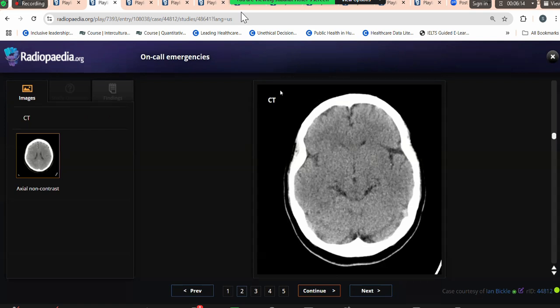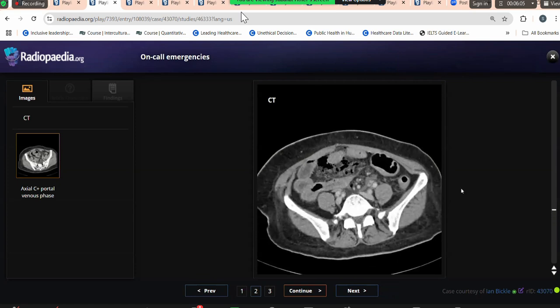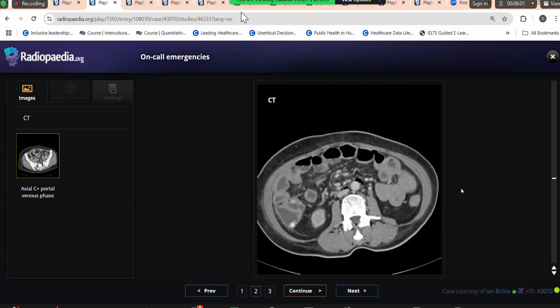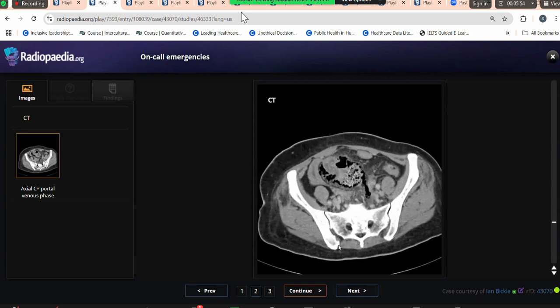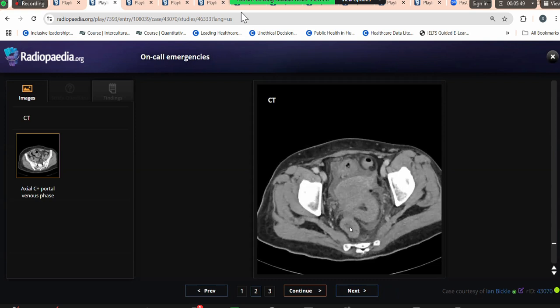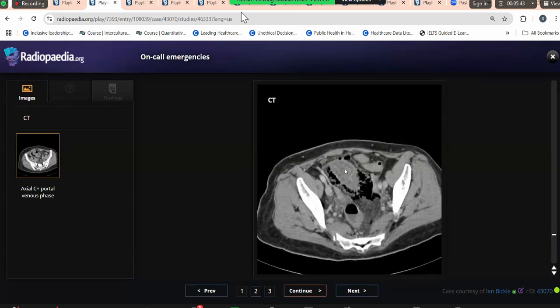After that, candidate 3 came up. Now here again, what I feel is all of us should be a bit more systematic. I'm very happy with how the Vivas went, but this is just for improvement, yeah? So once you have localized what the finding is, where the pathology is, concentrate there, and always trace the colon. Now look, this is the rectum. You guys can see my arrow, right? So rectum, and then we have this looping sigmoid, yeah? Sigmoid, sigmoid, sigmoid.